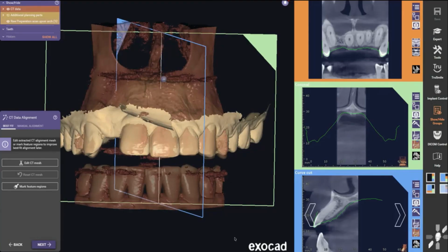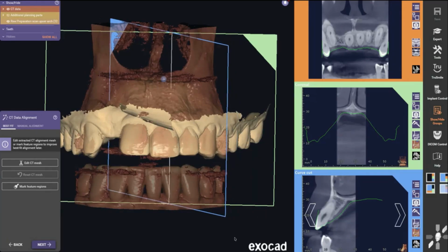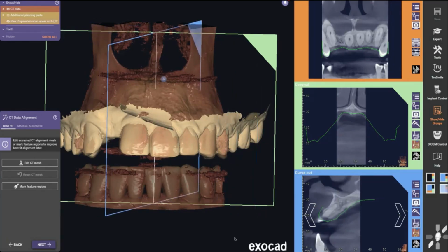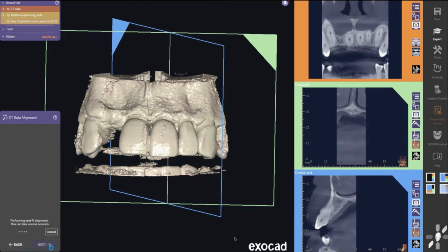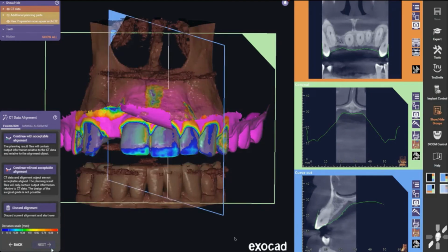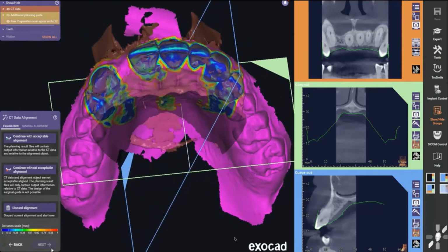So this is not perfect yet. This is just putting it in the orientation that we want. Right? We've had scans that were the wrong scans sent to us as well. So you've got to make sure, obviously, that everything matches. Next thing it'll do is automatically align it. So blue is cool, right? That's a good sign when everything is lined up, right?